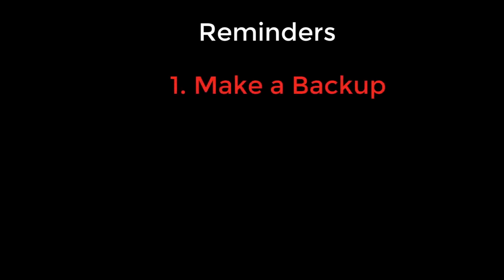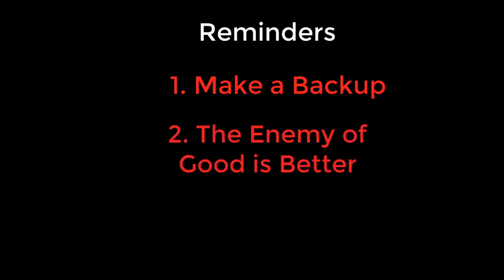Before we start, keep 3 things in mind. 1. Make a backup folder of the subject you are editing. If you make a mistake, it can be difficult to undo it. Edits that are saved are permanent, just like your insecurities. 2. Remember that editing the data too much can make the surfaces worse. Be conservative when editing. If your data quality is good, Recon-All will be very accurate in creating the cortical surfaces.